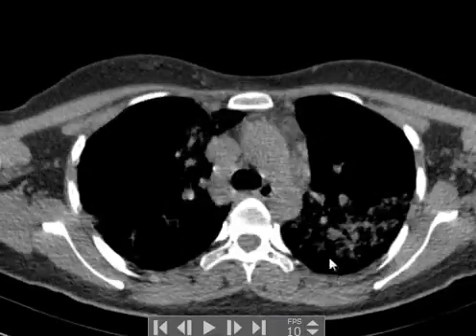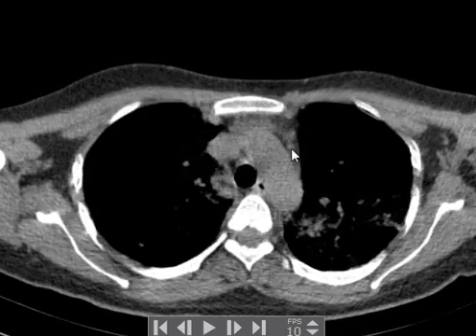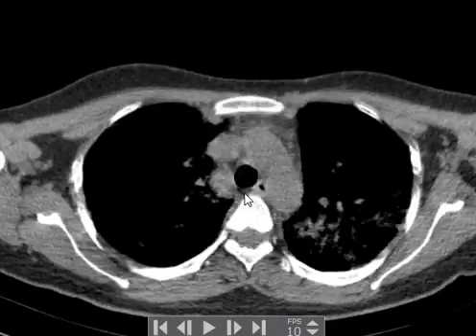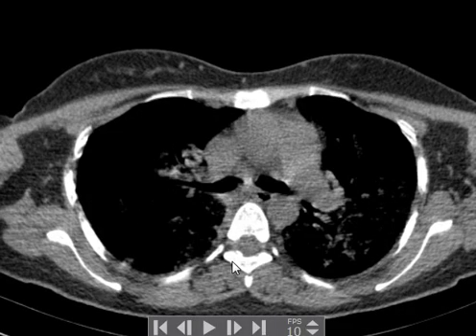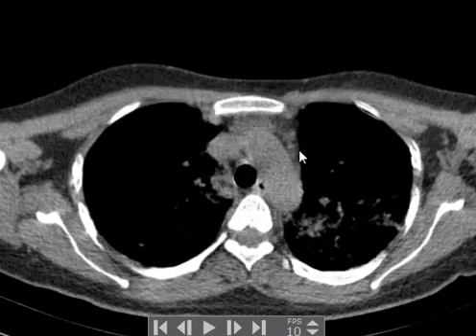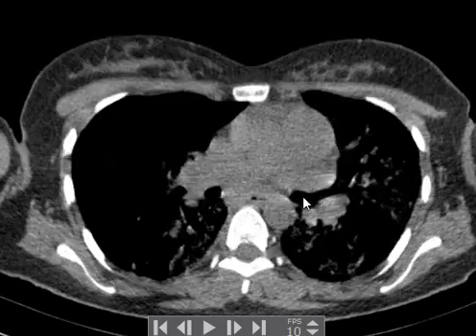And you can notice that the lymph nodes are just few small, maybe here, tiny lymph nodes, not the way that you would expect from this severe infection. If this was a bacterial infection, believe me, there will be bilateral pleural effusion, and there will be some significant lymphadenopathy, as compared to this patient here with just a few tiny, probably insignificant lymph nodes.